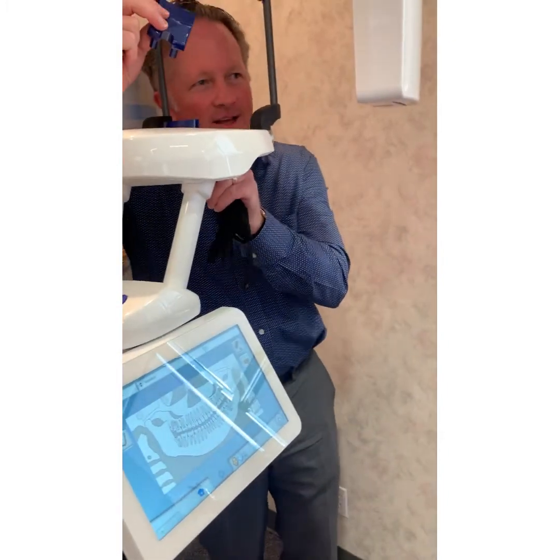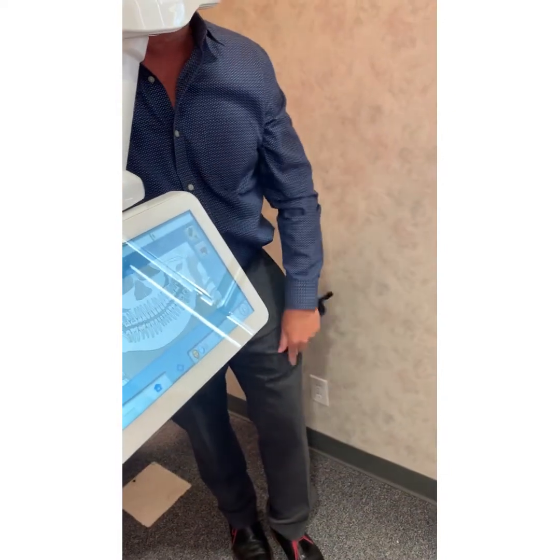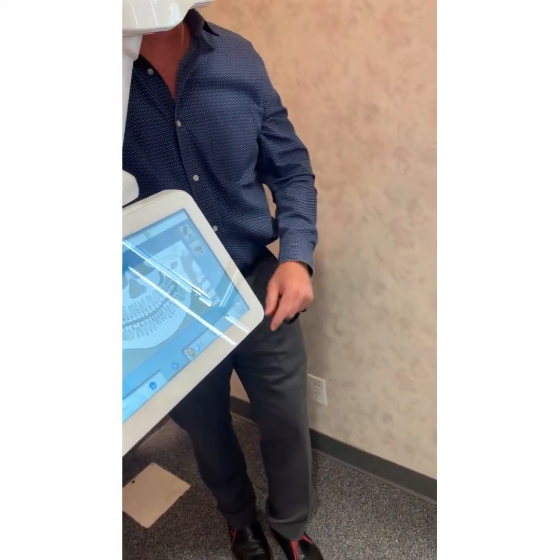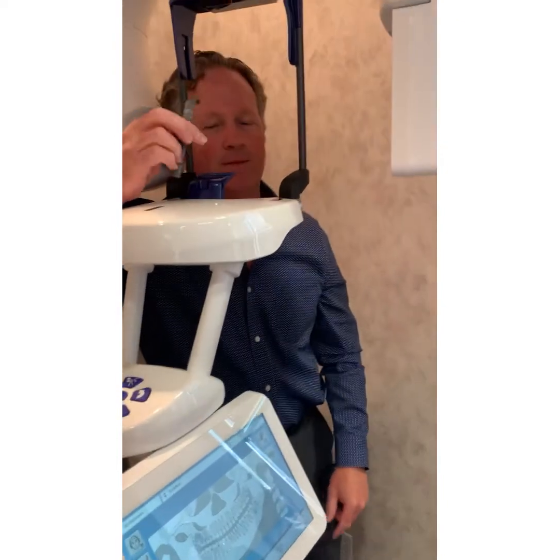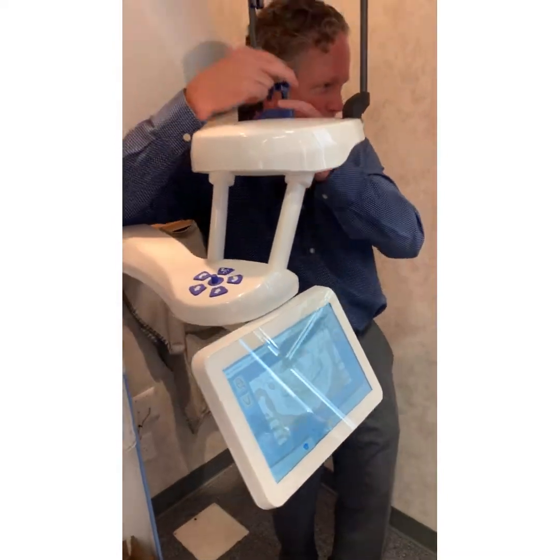That's the biggest complaint, that the first patient of the day has a lot of foundation, and it ends up on here. Even maybe a little piece of tape or something is always good. When we're cleaning up all of our rooms at the end of the day, double check that, make sure there's no makeup on any area, and it's going to be taken off.